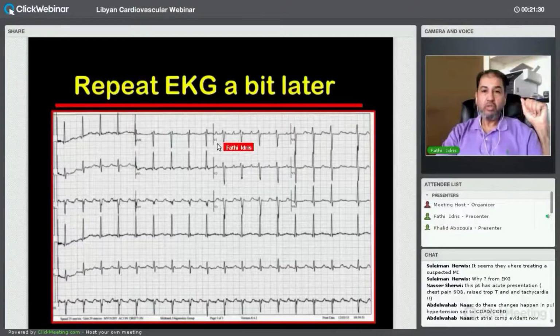So number one, and number two, I want you also to pay attention to lead V1 here. So lead V1, you see nice P waves, right? And then the PR interval is relatively long, like the other one. But now we don't see the incomplete right bundle branch block. I just want you to pay attention, and here is the money. Here's the most important part of this case. If you think lead V1 is incomplete right bundle branch block, there's R, S, R. R, S, R is gone. There's no R prime here. And this is clearly there's no R prime.